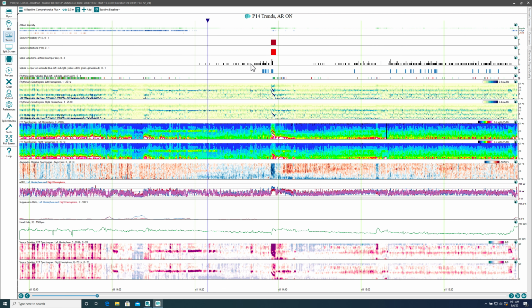And then we start to get some spikes. The spike intensity increases. So you're seeing spikes, maximal on the left, indicated by the blue color, at increasing rates, and then the patient has a seizure. The patient wakes up briefly and then falls back to sleep. And the spikes continue, as we can see, looking at the rest of the page.